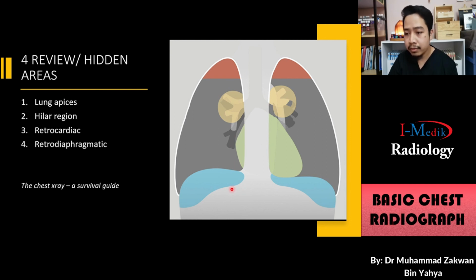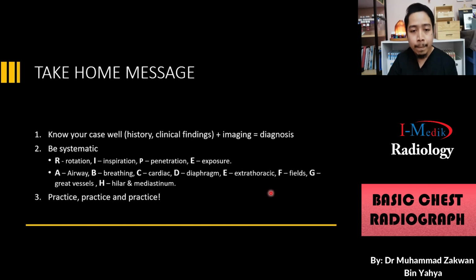Not only do we have to see both bilateral lung fields, but we need to scrutinize all these areas, especially not only in exams. Every single day, every time we see a patient, we see the chest radiograph belonging to the patient, we need to see all these review areas. Okay, that's all for my sharing today.